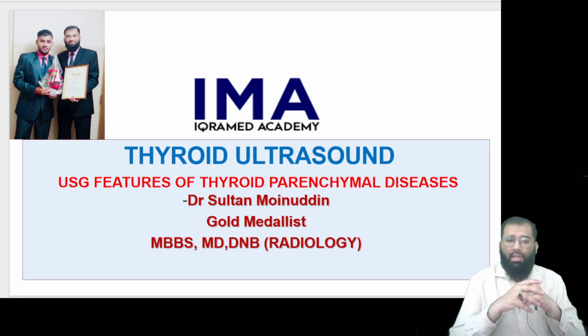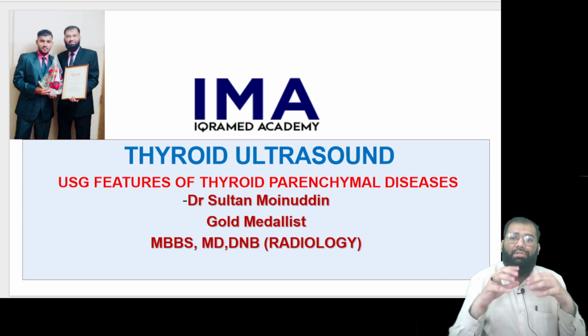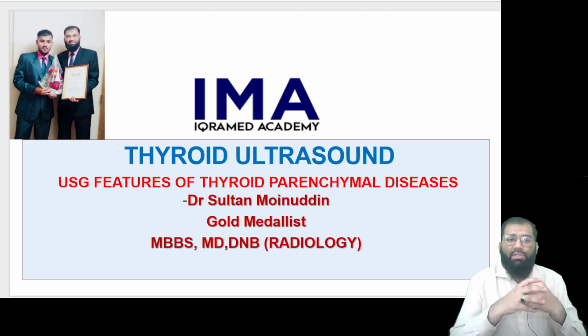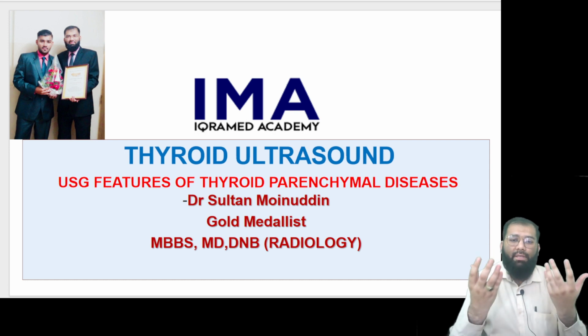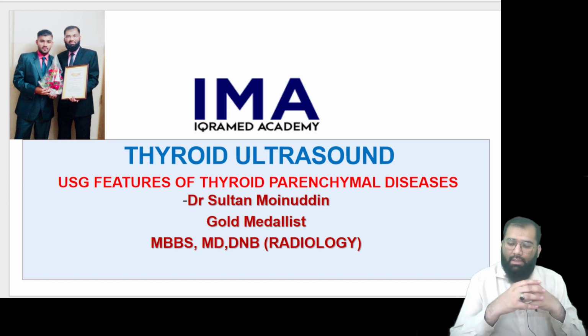अब इस लेक्चर में we are going to see a special type of thyroid diseases, especially what we call them as thyroid parenchymal disease. What do you mean by thyroid parenchymal disease? These are those diseases in which the thyroid parenchyma is involved. Here the entire thyroid parenchyma is involved rather than a focal lesion inside the thyroid gland.